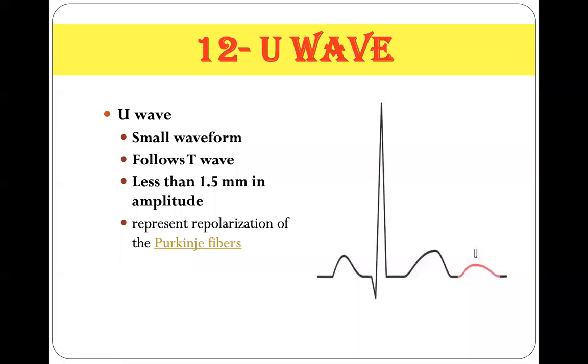Hello and welcome back. Finally, we have reached the 12th code of our 12 codes for ECG interpretation, which is the U wave. Unfortunately, the U wave is usually absent, but sometimes you can see it.